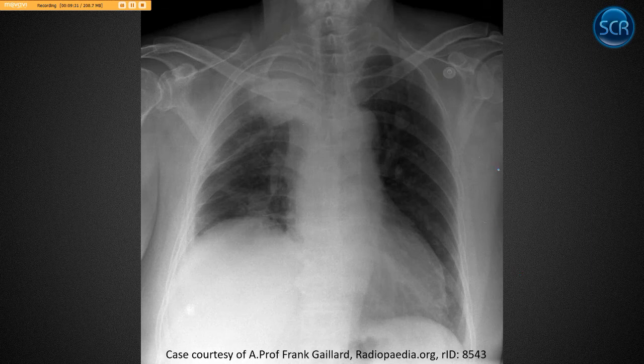All right, so this is another example where we can see a Pancoast tumor, right? We look at the lung apice, there's a lesion here. Maybe not necessarily Pancoast tumor. I think this was a met, and then you can see there's other metastatic lesion here. And you see that this one, again, has invaded and destroyed the phrenic nerve, so they've got a big phrenic nerve palsy with elevation of the hemidiaphragm, right? They're unable to contract it because this thing has destroyed their phrenic nerve.